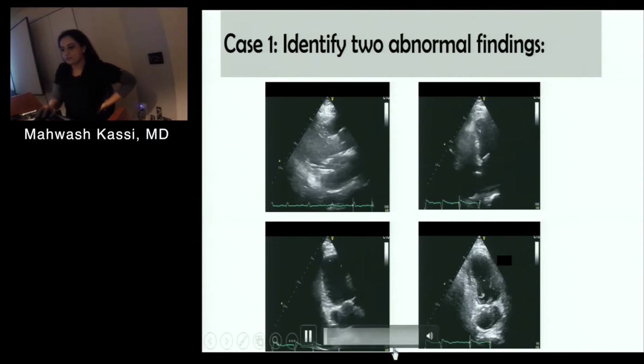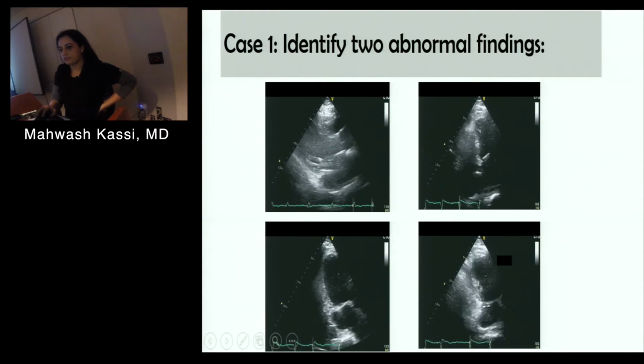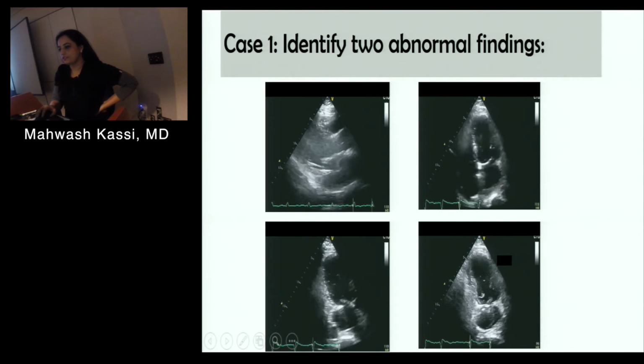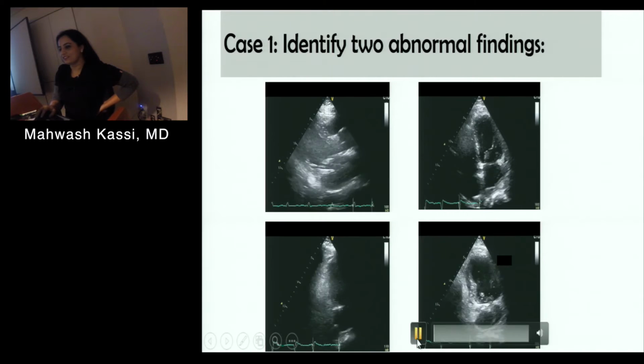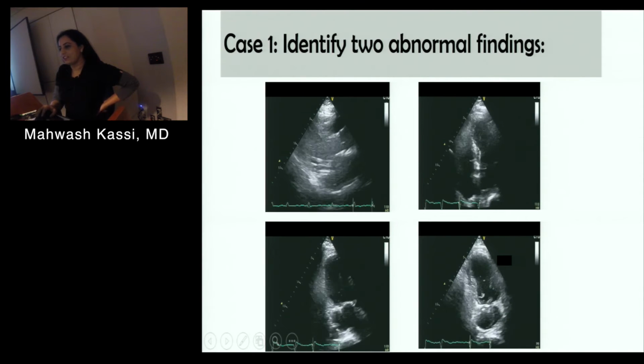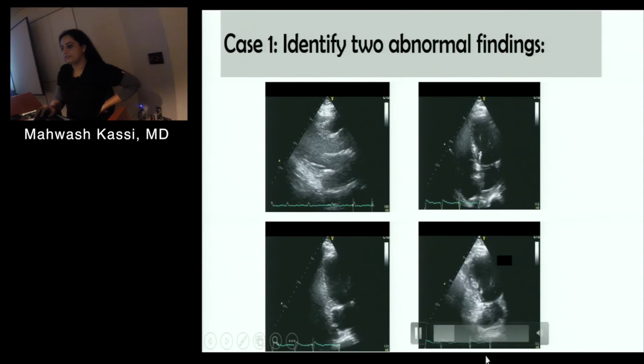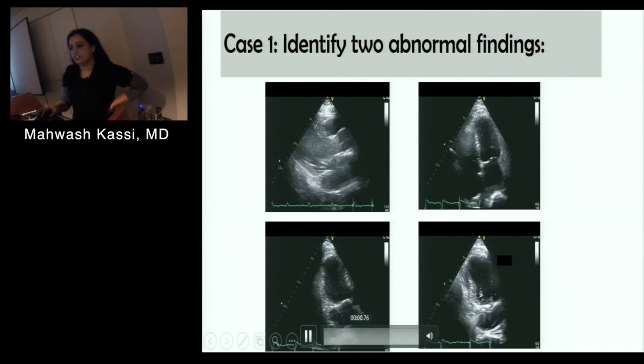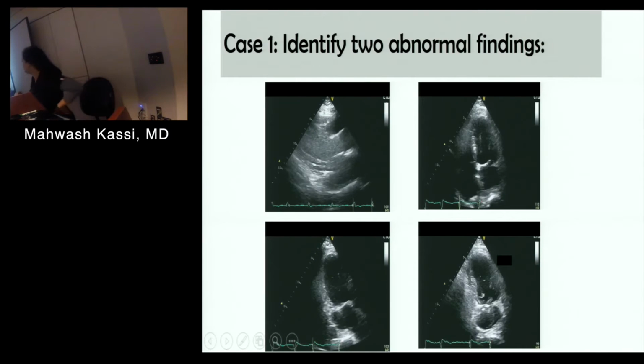Something moving. I thought that's a leaflet. What is it? Like fog or like a mass? Do you see that thin little structure? What could that be? You also see it over here, and you see it on the bottom too.